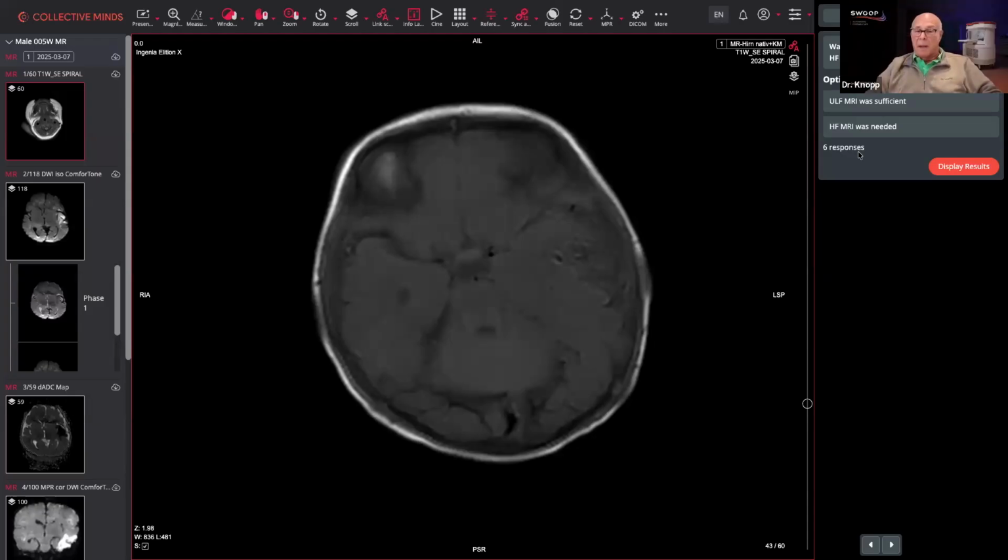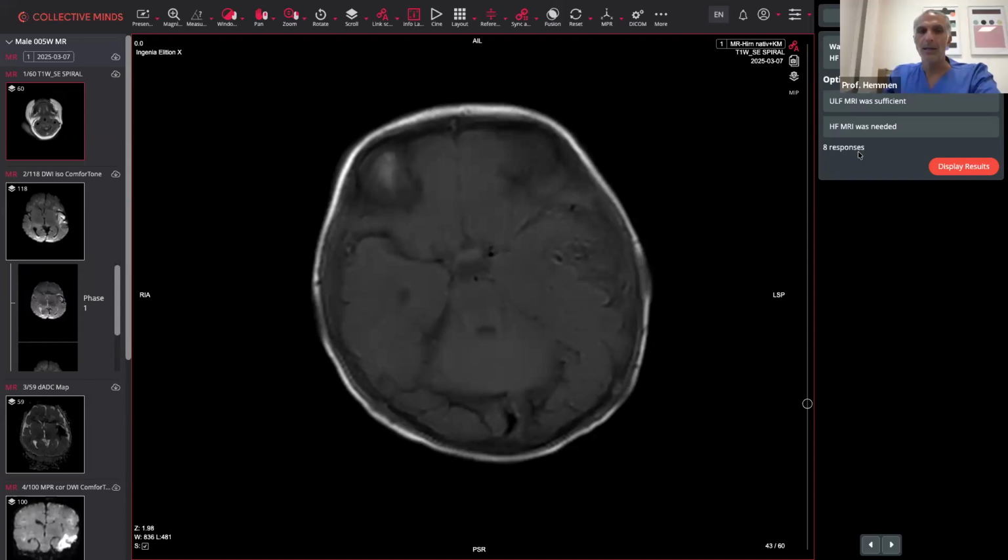I would think that I could make the diagnosis, albeit not a pleasant one, that the child has intracranial and extracranial trauma with intraparenchymal hemorrhage, contusions, extraaxial collections, all just from the Swoop image. And I think that depending on his clinical state, the high field, in my mind, I would not recommend a high field follow-up. Yeah, exactly.